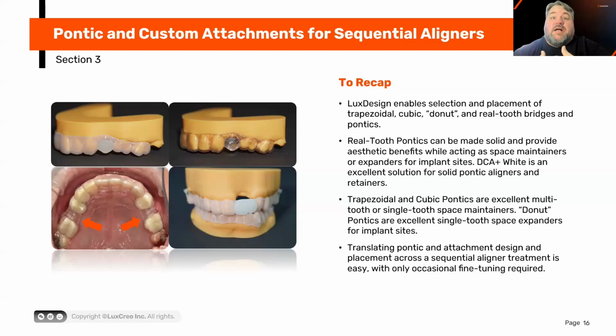Yeah, listen, LuxDesign enables creation of all types of pontics depending on the clinical need. You can see some real world examples here. Real tooth pontics provide those aesthetic benefits, but maintain the space. You can see with the DCA Plus on the upper left, with our DCA regular clear in the upper right, and we also have those other shapes.